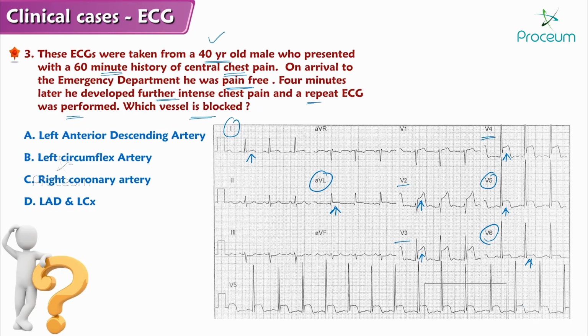So in the anterolateral leads there is presence of ST segment elevation.